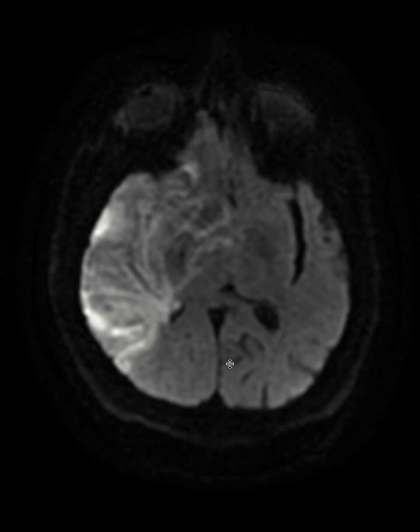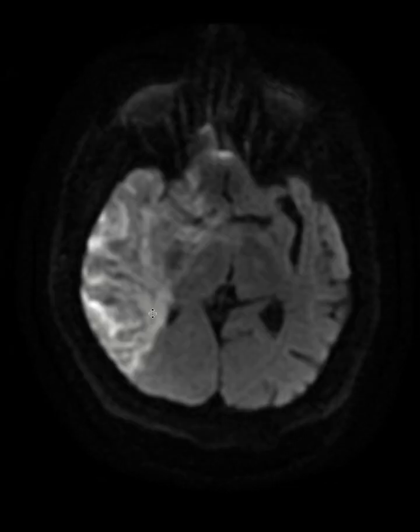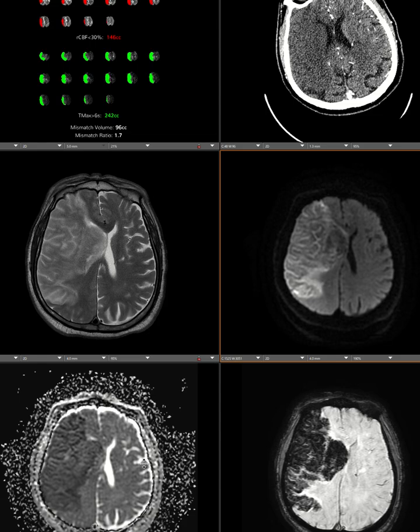This is a hallmark for stroke diagnosis. On the DWI sequence, you see that the whole right cerebral hemisphere is just bright. There is a lot of restricted diffusion on the right side involving the basal ganglia. And if you want to be accurate, we have to look at the ADC map. You see that the right side is just dark. So even though we did the intervention, because the area at risk was a very large volume, we still have a big infarct in the right cerebral hemisphere.